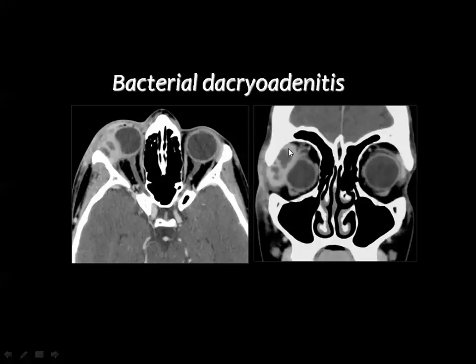There is considerable swelling of the lacrimal gland compared to the normal one, and there are multilocular collections of pus showing a thick marginal enhancement with a swelling and edema of the related soft tissues, and you can appreciate also the compression or the impingement on the right globe.